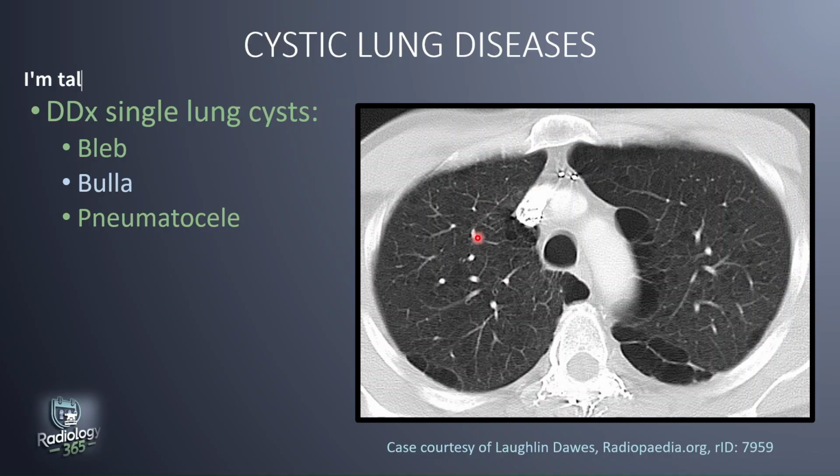So in this axial CT scan of the chest, we see these cystic subpleural areas which are much larger than the bleb that we saw. We'll talk about this later, but there are some emphysematous spaces within this lung as well, and this was a case of bullous emphysema. So these cystic spaces in the subpleural region are bullae, larger than the bleb.